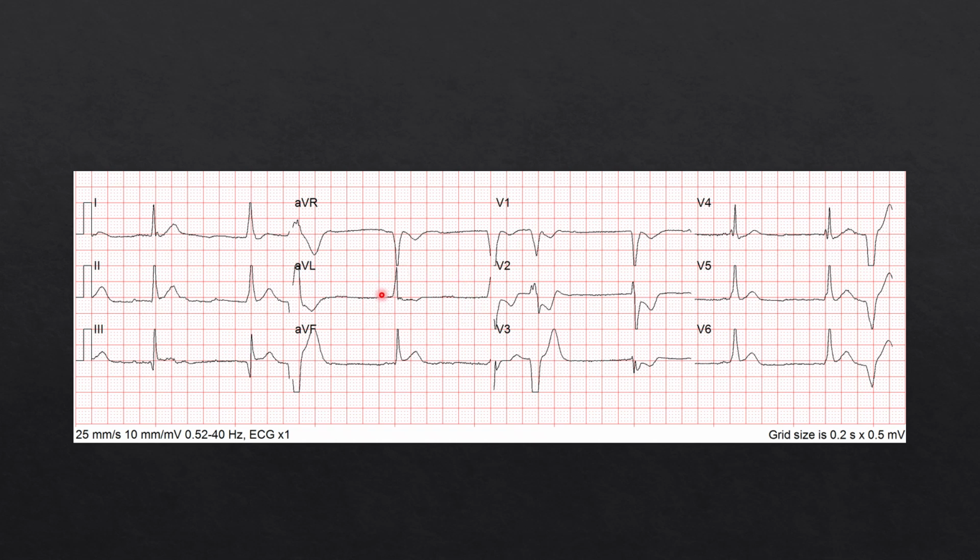So we have a flipped T wave in AVL with some mild ST depression that isn't present in lead 1. We see the beginnings of a Q wave, some straightening of the ST segment. And so as this case progressed, the patient eventually required pacing, which is going to obscure your ECG at that point because they're getting transcutaneous pacing. But they were able to get to the PCI facility, successfully cathed, and had 100% RCA occlusion.